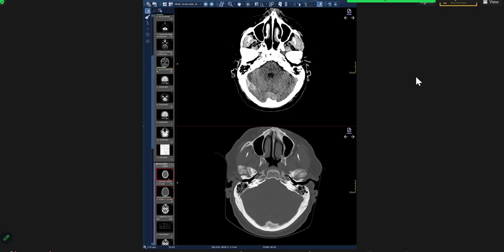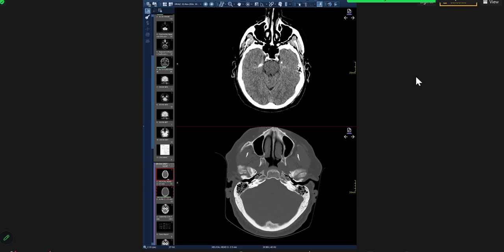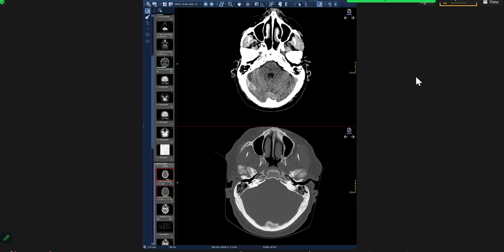Now in this example, it is looking dense here, right? And you could have thought that maybe it's trauma. There's blood in the tentorial leaf. That could also be a cause there, right? But then you follow and you see that the sigmoid sinus looks abnormal. So then you know that maybe this is something else. Sometimes it is the increased density, sometimes it is the low density.